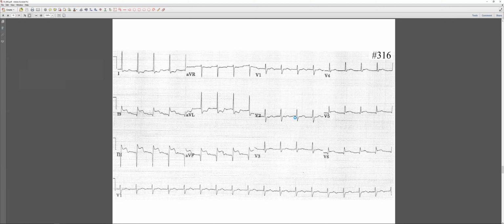No, the QRS is narrow. No, sorry. But again, the RS ratio, especially if you do have an acute inferior MI, you should check for the posterior wall. Do you have any extension? And here what you do see is that the initial R is tall. Only this. Yeah, so it's a posterior. Yeah, the ST is not depressed too much, so I won't say that, but it looks like we do have a necrosis on the posterior wall as well.